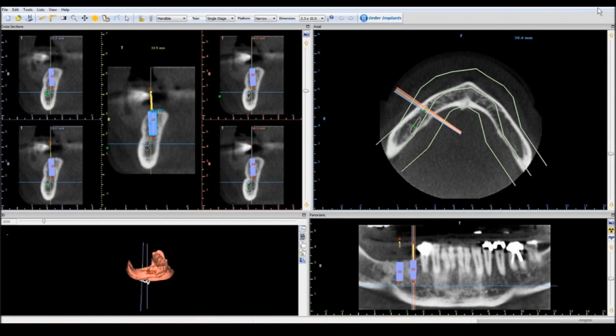The first case I'd like to discuss tonight is a straightforward case, missing teeth number 29 and 30. And basically, the approach we've taken, we want to make this streamlined. We want to make guided surgery feasible, simple, minimum effort. And one of the things I think we have done to a large extent is eliminate the need for barium sulfate-coated teeth or wax-ups. Not 100%, but to a large degree. And I'll illustrate that with this case.